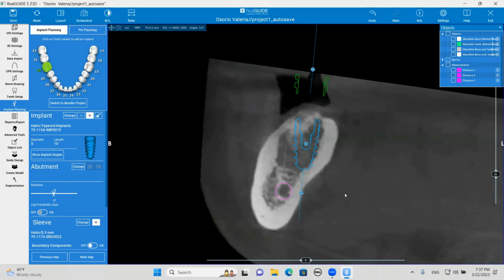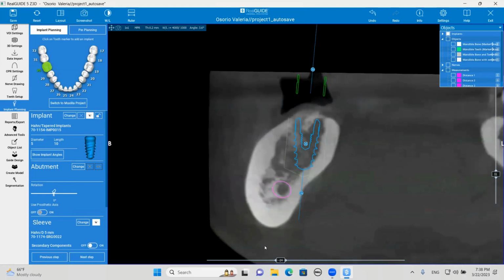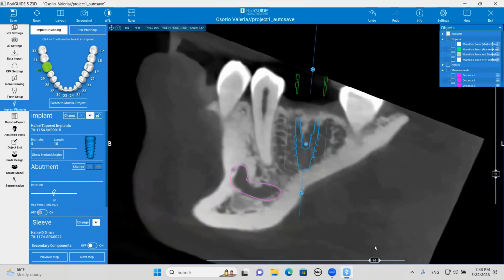So what I would do is treat this as our D4 surgical protocol. Most likely I would under prep it by 2 burrs, Jimmy, on this. And were you planning on doing this guided? Okay, so I would definitely do this guided, just to get the buccolingual and mesial distal positioning of that more ideal, so that you stay right as this has been treatment planned.